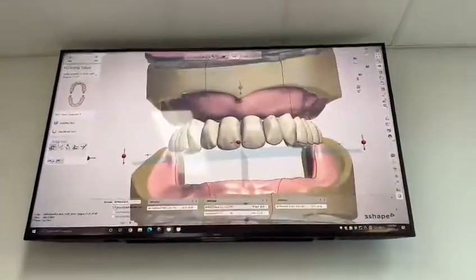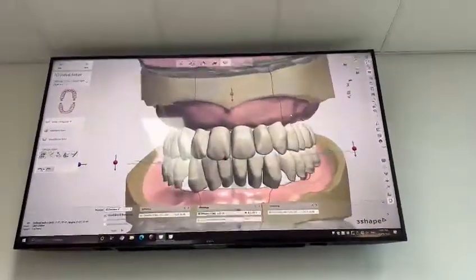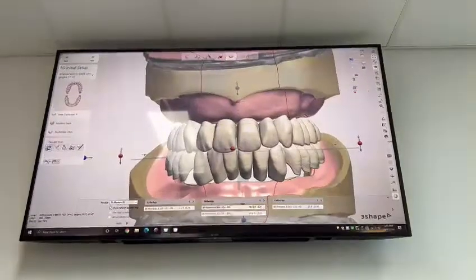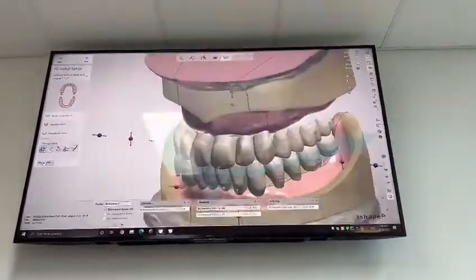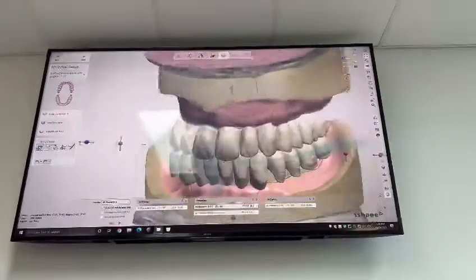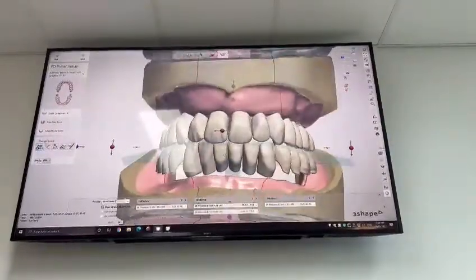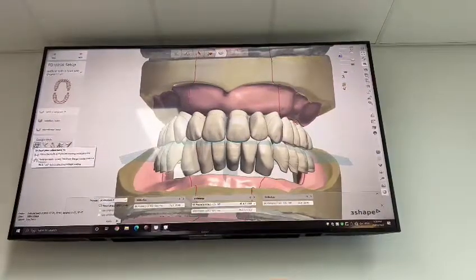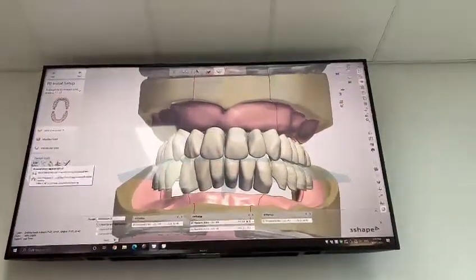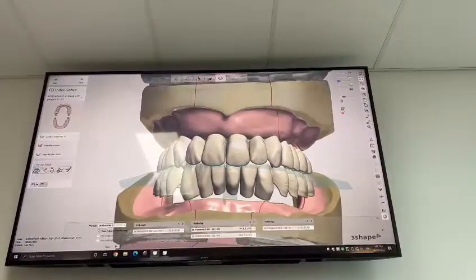Now if I turn this on, you see we have that 3/4 of the way up the retromolar pads. Beautiful, okay? Got enough room. So that's really the first part done there. Notice I've used everything in this global occlusal plane adjustment. We work from left to right.